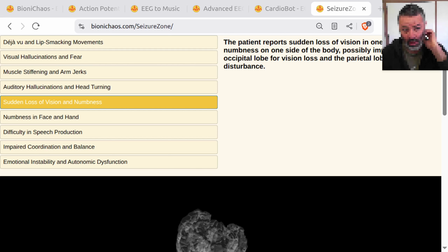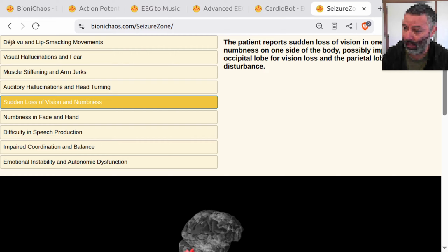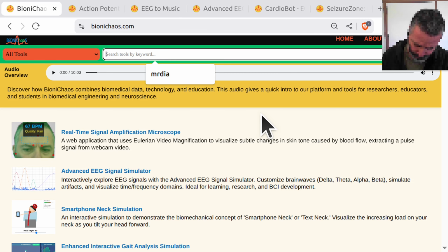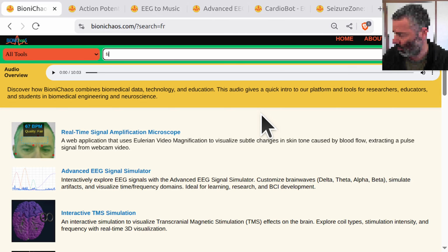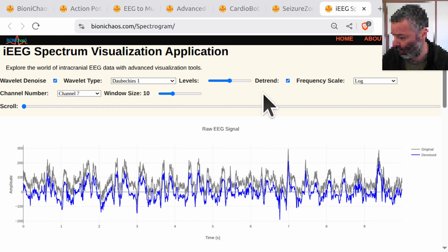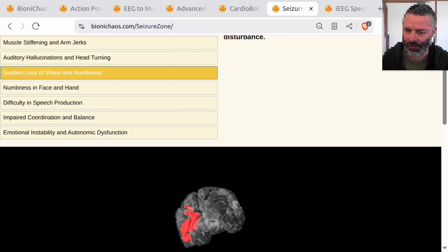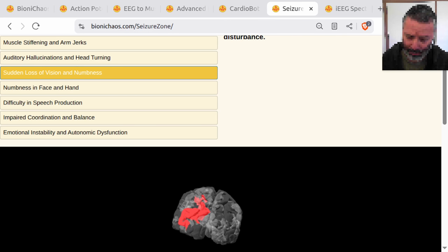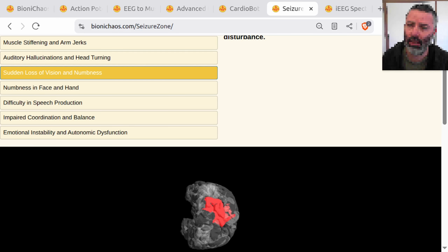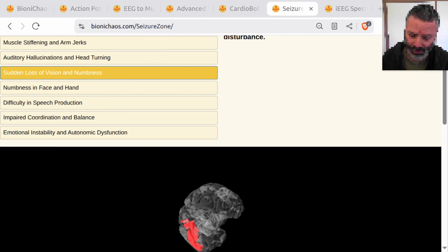Yeah, that last one doesn't seem to be correct. It's hallucinated on the last tool. We do have a frequency spectrum. I think it got mixed up with this spectrogram tool. I think you got the two tools mixed up. Can you look at each link and describe each one again? Make sure you actually visit the URL.